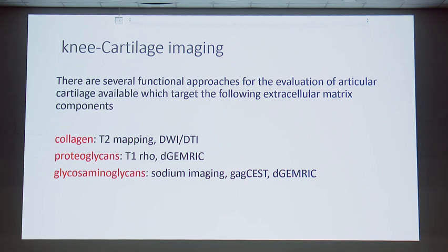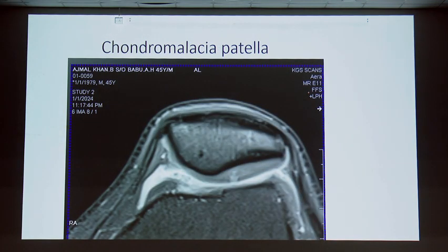The first one is what we are doing regularly, and this is how we see it. First we do a very good PDFS or MEDIC sequence. Beautifully we can see the cartilage. You can see there are 5 layers, at least 3 layers you are able to judge: the first, the second, and the third, then the cortical bone. And what is happening, how much depth it is going, is it normal or signal changes alone, is it a defect of 50%, more than 50%, bone marrow changes.